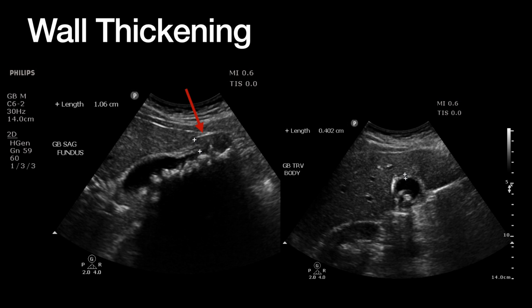And so as you begin to inflame this thing, it'll thicken up and you'll have something greater than 3 millimeters in thickness. What I've oftentimes seen is there may be some diffuse thickening globally, but I'll oftentimes see areas that are patchy where we have some worse thickening than other areas. And so it's this heterogeneous thickening of that gallbladder wall. And because it's an inflammatory issue, because there's a lot of edema in that wall, you'll have this heterogeneous appearance of the wall itself, right? Just this really ragged, ratty looking, mouse eaten view of that gallbladder wall.